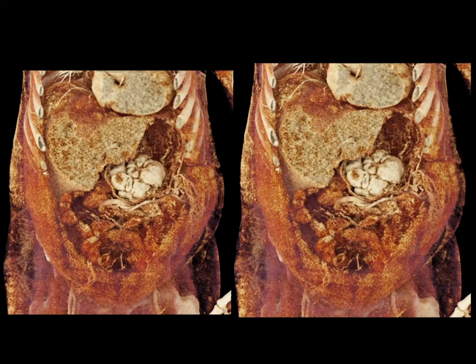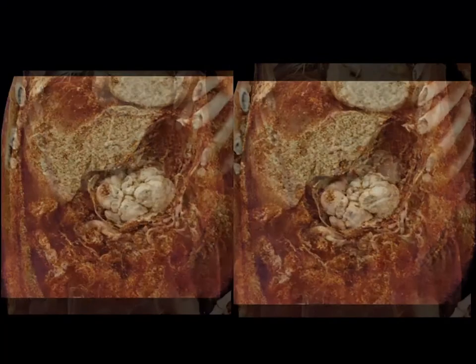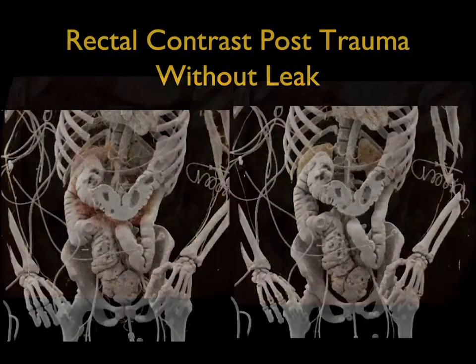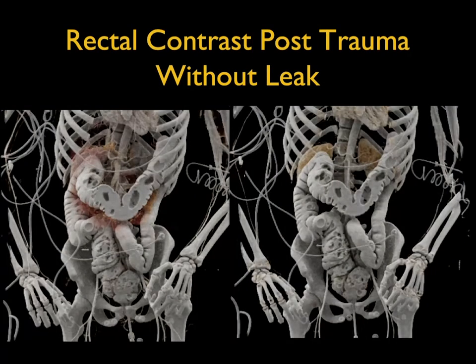There are liver mets and lobulated gastric masses consistent with metastasis. That is what we're able to show with cinematic rendering. It's just spectacular. Now, we also have looked, what could we do with contrast?